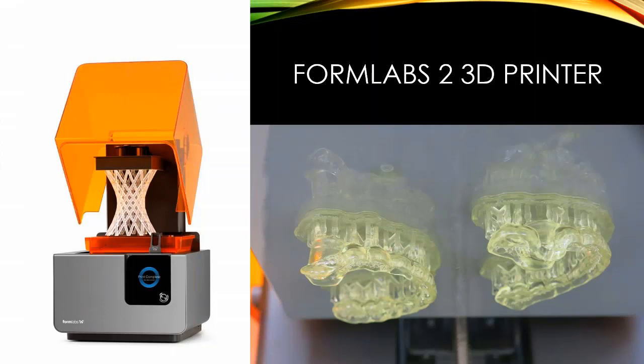3D printing is amazing today for these applications. This is really the main application we use our printer for. FORMLABS is a very cost-effective printer, not very, very fast. Takes about 3 to 4 hours to print out models. You could print 10 to 12 at a time with something like this. But you get a very accurate print in a very cost-effective way. So this is the raw print as it's being printed on the right.